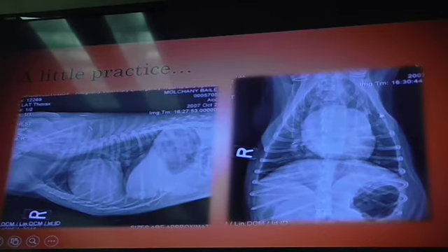So we're looking at this area here, kind of bulging out. And then you guys see this, but this is really where that bulge is kind of pushing this laterally. You guys see this area? It's kind of hugging and pushing this outward. Maybe. Possibly. Just go with me for right now.